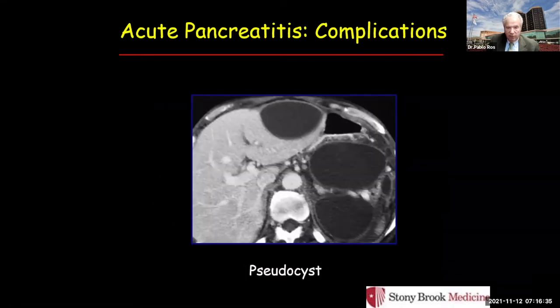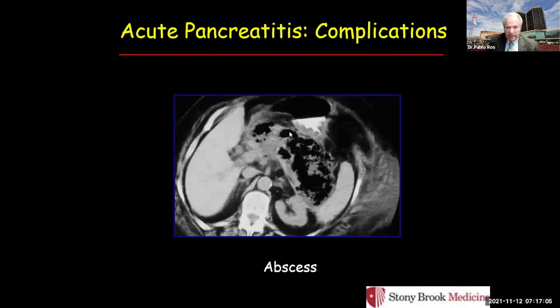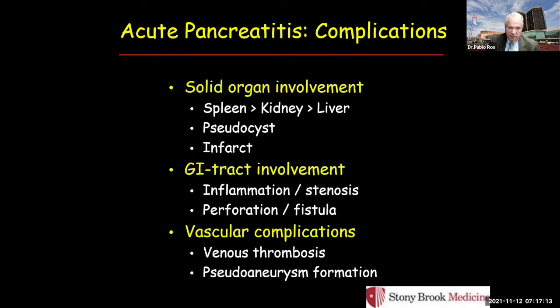So, examples of pseudocyst formation. This is a florid case with large pseudocyst. This is well established. The pancreatitis was several weeks ago, and here is a pseudocyst involving the liver in the subcapsular location, involving the wall of the stomach, involving the perisplenic area. Infected necrosis goes from just a little bit of bubbles of air, liquefaction, to here, little bubbles of air. Air is concerning, and then necrotizing abscess basically becomes plenty of air and all the trappings, all the clinical findings of abscess formation.